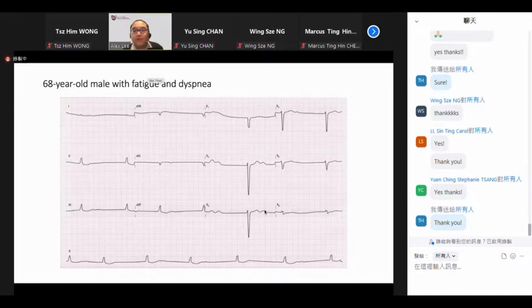No. Why do you think it is a U wave? Because it's after the T wave. Yeah, exactly. It's after the T wave, and it's a U wave, PQRSTU, right? It doesn't look like a P wave. It's a very large wave, almost looks like the T wave, but it's after the T wave. So the best guess is a U wave.